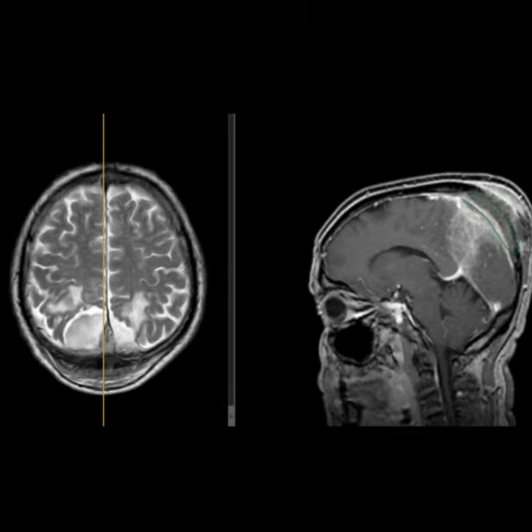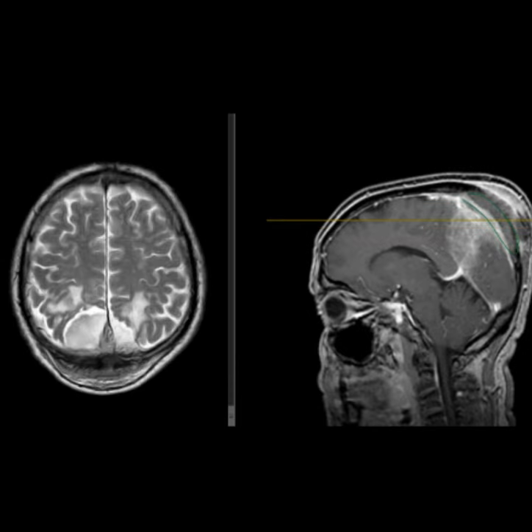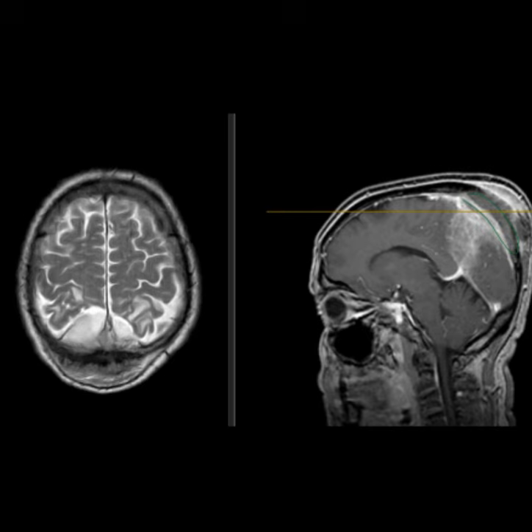Well, since it's based on the falx, on the dura, the main differential diagnosis will be a meningioma, and since it's extending through the bone, I would suggest hyperostosis and extension into the extracranial component.